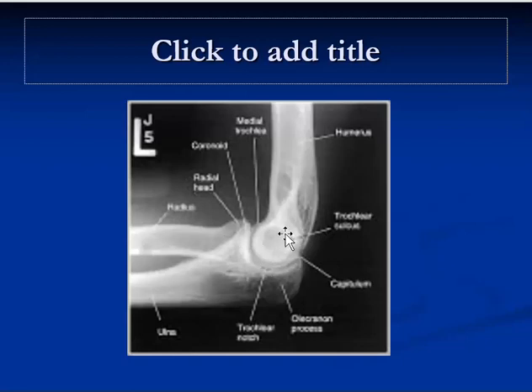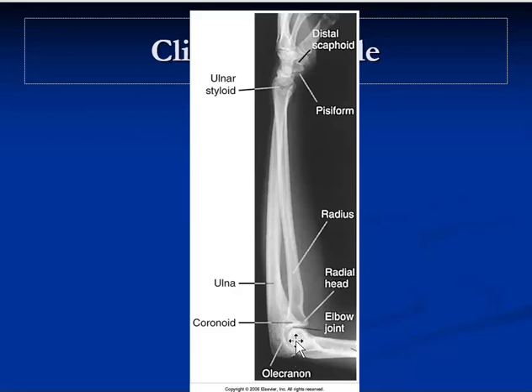So you got this one almost perfectly round density. You're not going to see that on a lateral of the forearm because, again, of this divergent central ray. But the positioning for the lateral elbow and lateral of the forearm should be really the same. Central ray location and collimation are fundamentally the only differences.